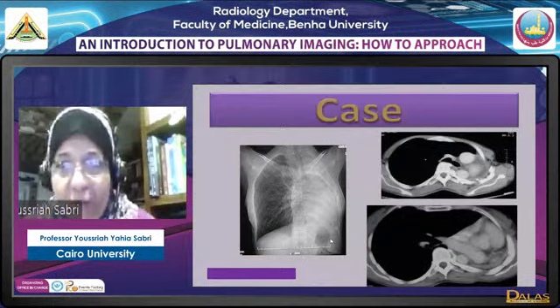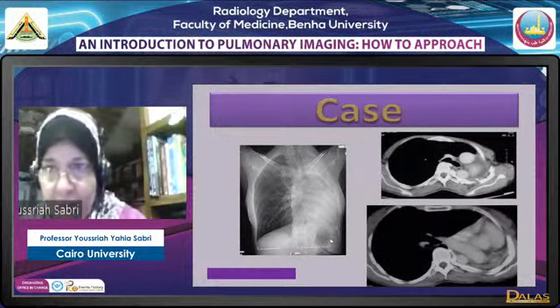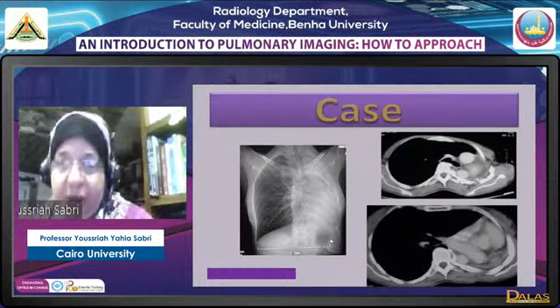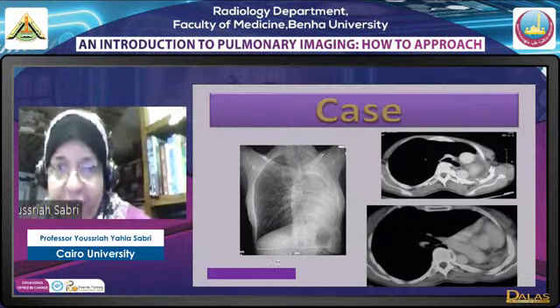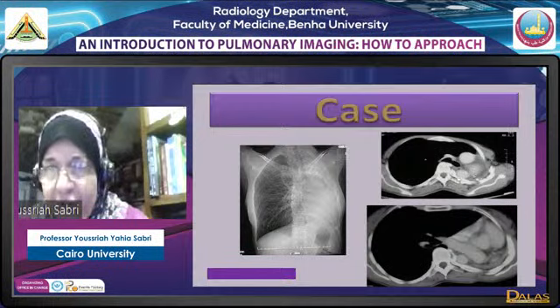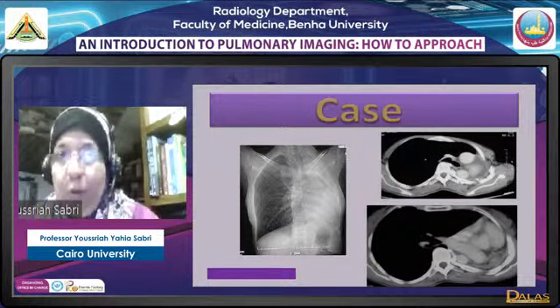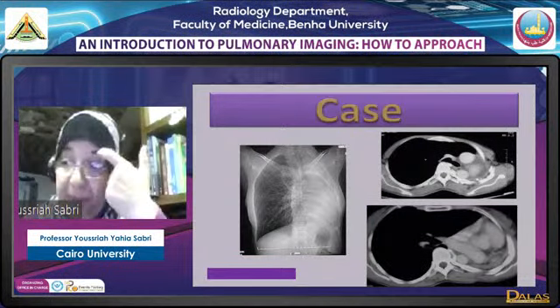What are the causes of volume loss? Either of two things. Either we have a collapsed lung or we have no lung at all. Now let us start. Collapsed lung means we see the lung but it will be small, or we see in CT no lung. If we look here in this opaque hemithorax with ipsilateral shift, these axial images show the mediastinum filling the hemithorax. There is no lung. What are the possibilities of no lung? Well, either there was a lung and it was removed, or there is a congenitally absent lung.